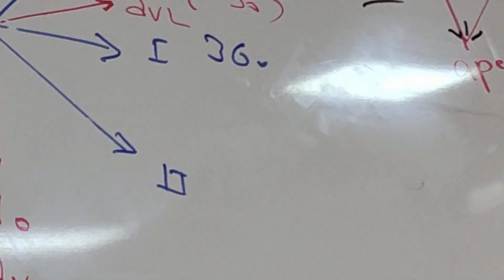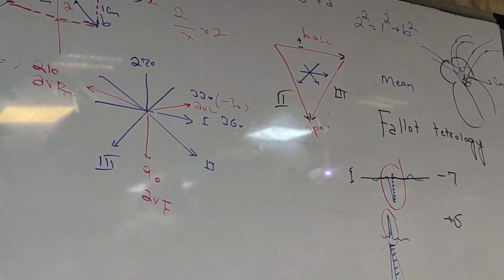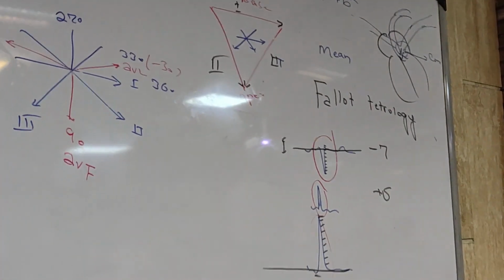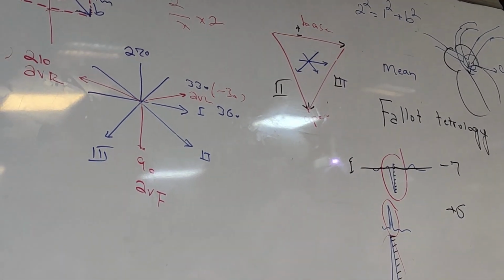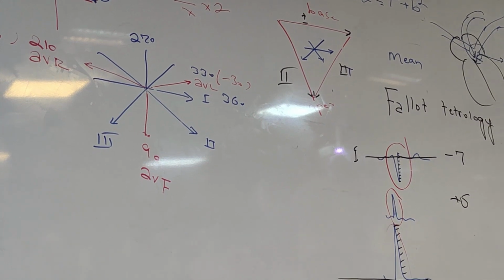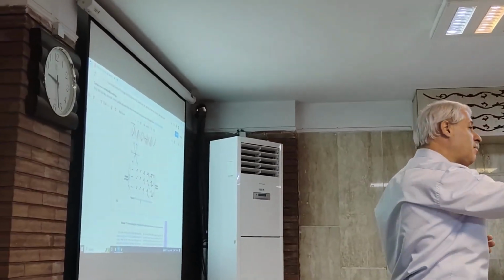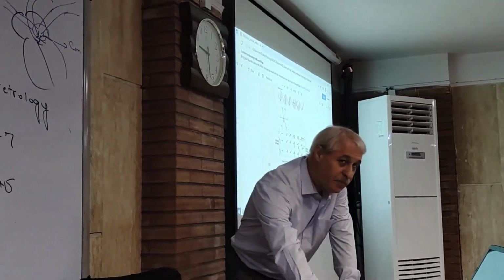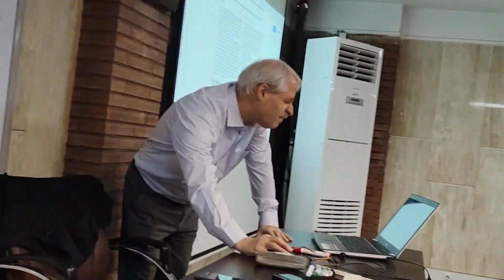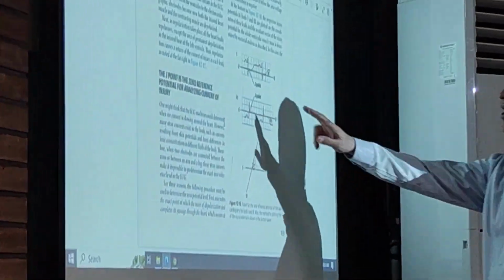If we want to see if there is an infarct area of the left or right ventricle, we take a look at the ECG trace. Make a perpendicular line in the TP segment. Take a look at these ECG traces. This is limb lead 1.